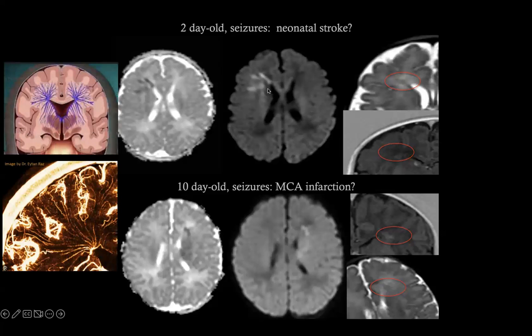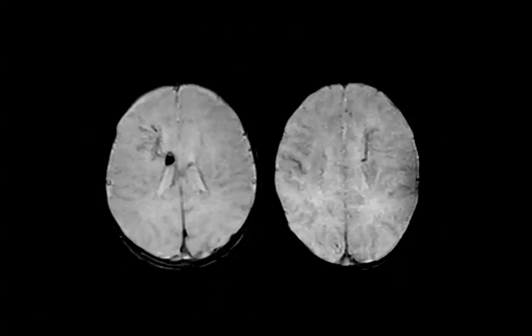If you look at this linear course, it anatomically corresponds to the course of the deep medullary vein that drains through the brain parenchyma. And this is confirmed in the same two cases on the susceptibility, where this engorgement, we call it engorgement rather than thrombosis because this tends to resolve spontaneously, is confirmed as these linear areas of hypointensity on gradient T2.